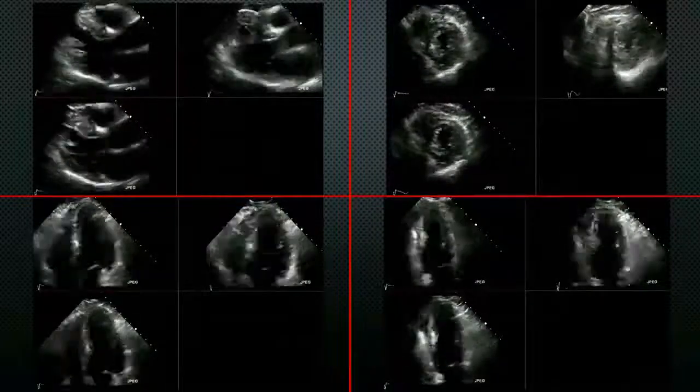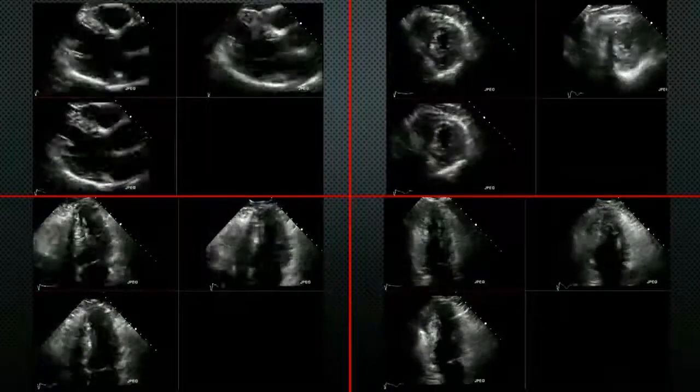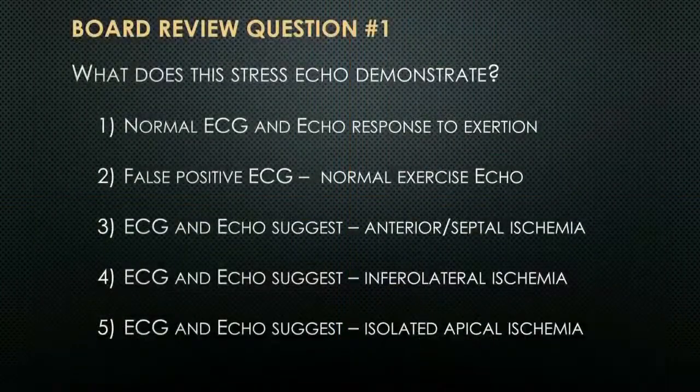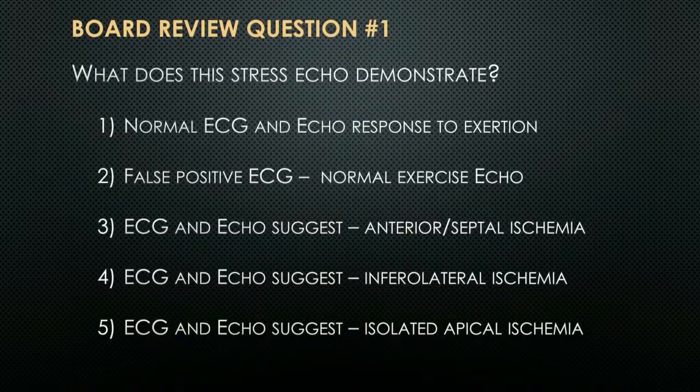So, do you feel you've had enough time to scrutinize the wall motion? I know it's tough because they're small and, anyhow. So, yep, ponder, contemplate, regard. Yeah, I'm trying to shake it up. I was looking for synonyms before.